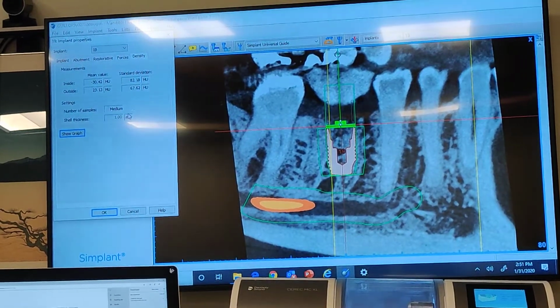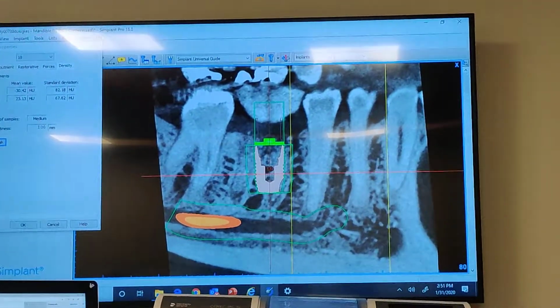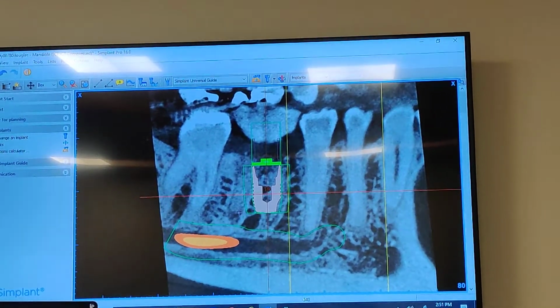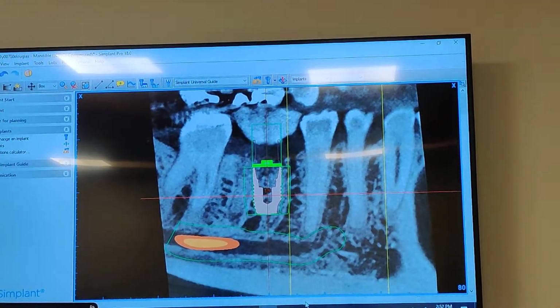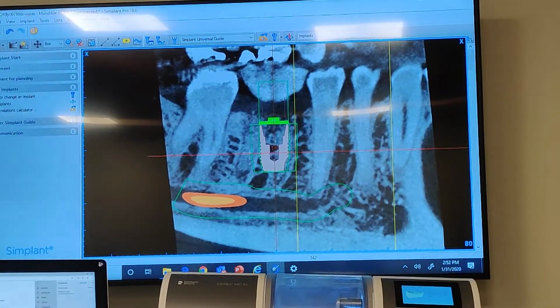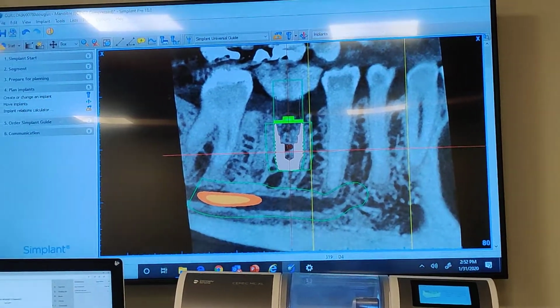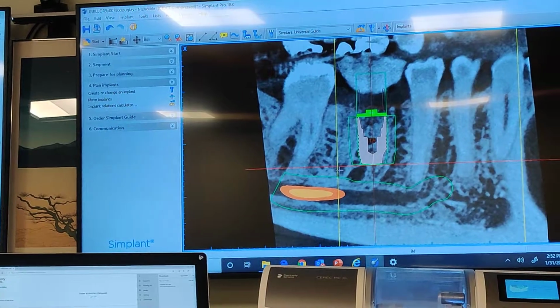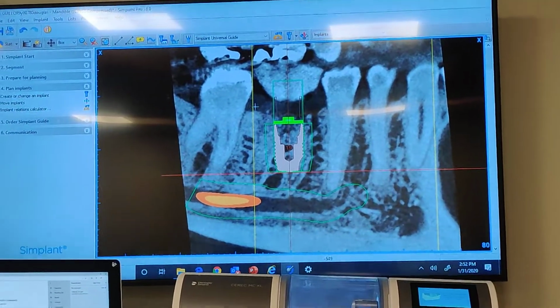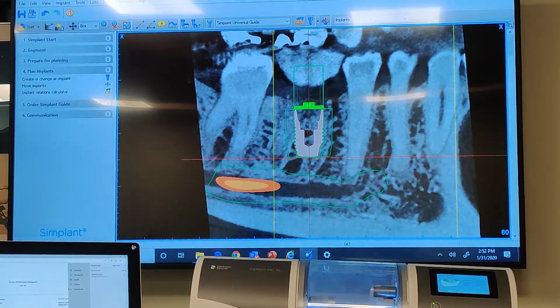This is looking at Hounsfield units, so I can look at the density of the bone. You may not have noticed, but I can also do that. Do you see my cursor? Look at the bottom of the screen. This is Hounsfield units. Now, the research says it's not exact, but it gives you a rough estimate. Do you see it say D4? That means it's poor quality bone. See, that's grafted bone. This is probably really poor down here. Look at that, 51 Hounsfield units. So if we get here, we'll have D1 bone. D3 actually. None of it's very good bone.